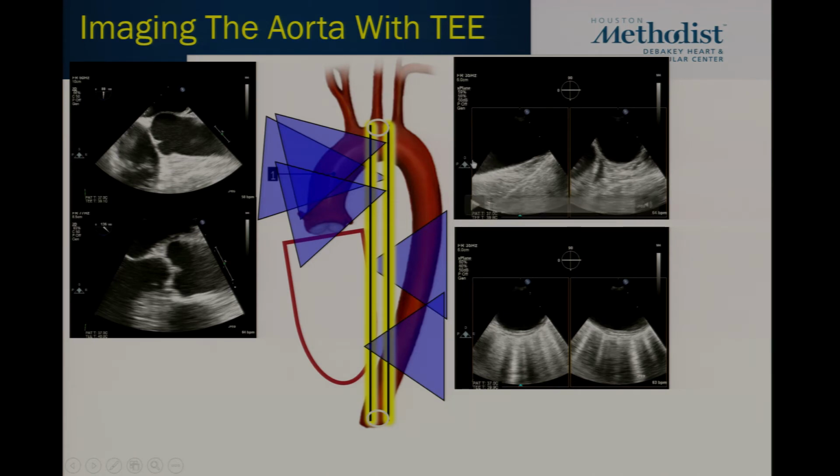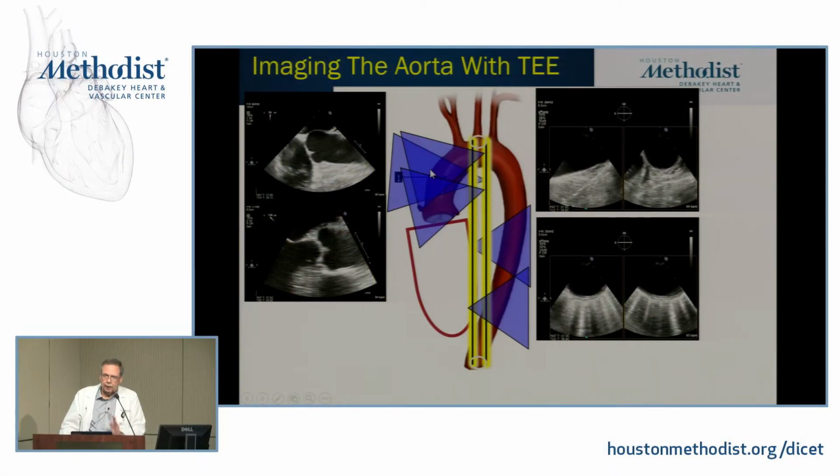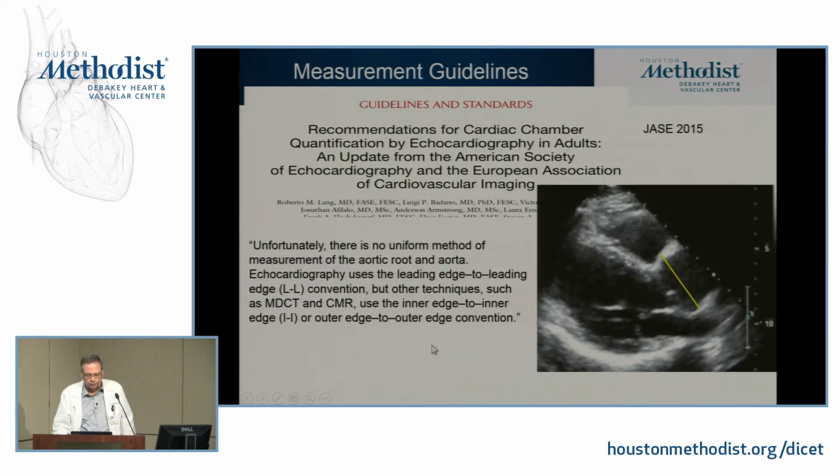This area between here and there could be a blind spot, which is one of the areas where TEE could miss pathology, just because the trachea gets in and you have air. So that is the weak link in TEE to make the diagnoses of localized dissections or intramural hematomas. Other than that, you have a good look at the aorta, even down to the proximal descending aorta.